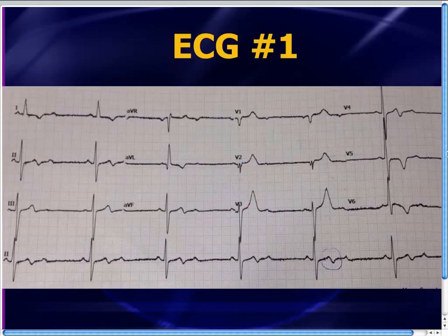Well, people haven't really written about this before, but it's certainly been an observation to many of us that there's nothing special about biphasic T's in the mid-precordial leads. If you find them in the inferior leads, you're going to need to worry about right coronary artery subacute occlusion also. And I don't think that this patient ended up having a cath, so we don't know for sure, but it is something that's worth mentioning and being on the lookout for.